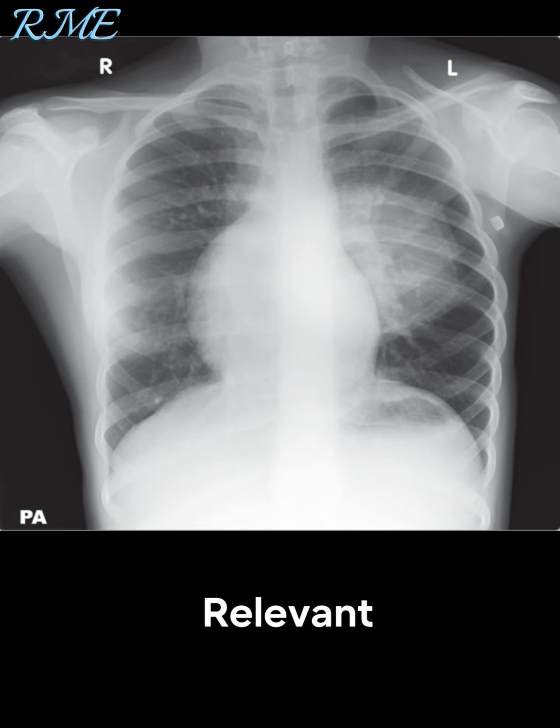Review of any available relevant previous imaging would be useful to clarify and assess for change, and it would be useful to confirm whether there is a past history of surgery. So our diagnosis is a 14-year-old girl with Poland syndrome and a left-sided pectoral implant.